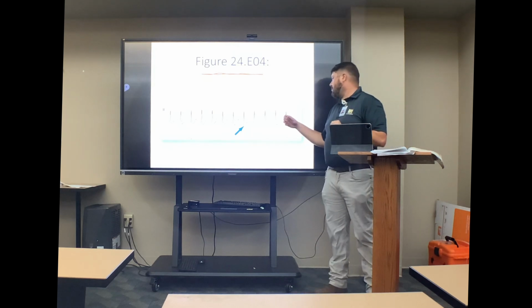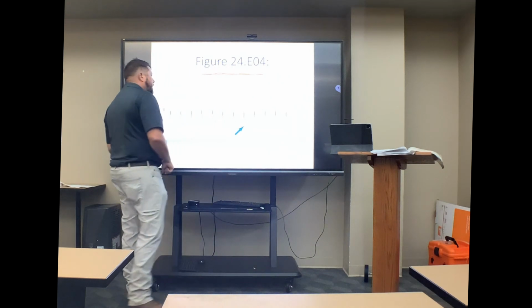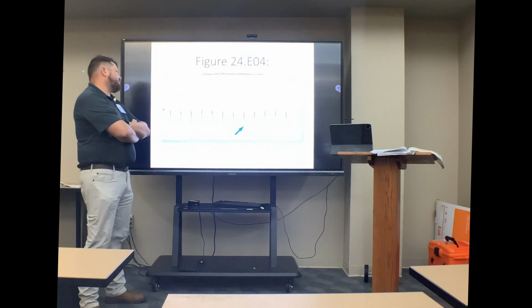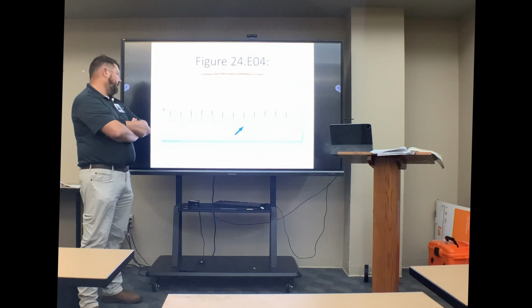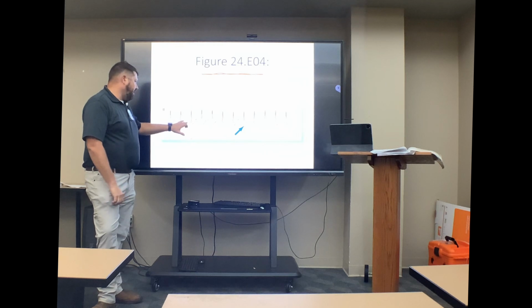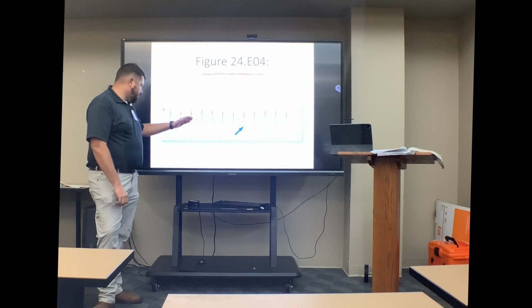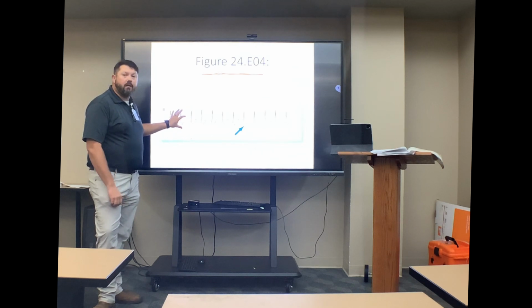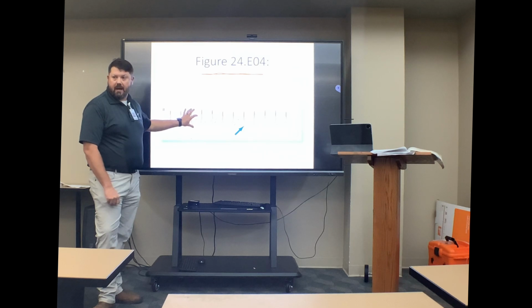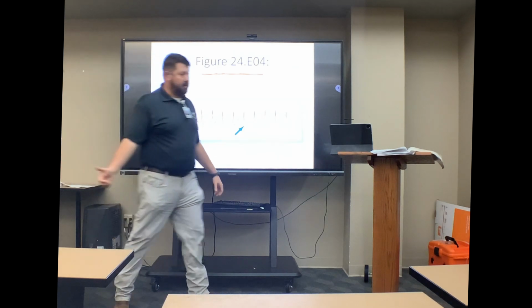Okay? But this is a rate of 120. So it's not a super tachycardic rate. This one right here, because I see there's no P wave before it, but I do see this post QRS P here, the pseudo S wave, which would be a post QRS P. I would be able to call this one a junctional tach because the rate doesn't exceed what we would go for an SVT.